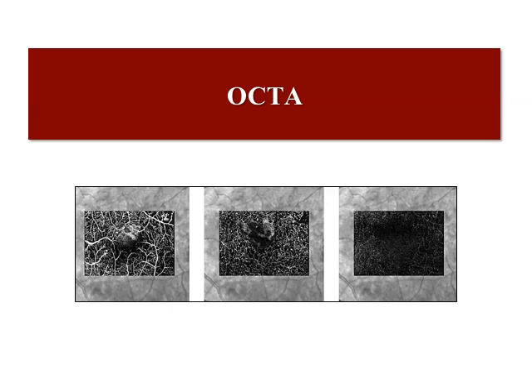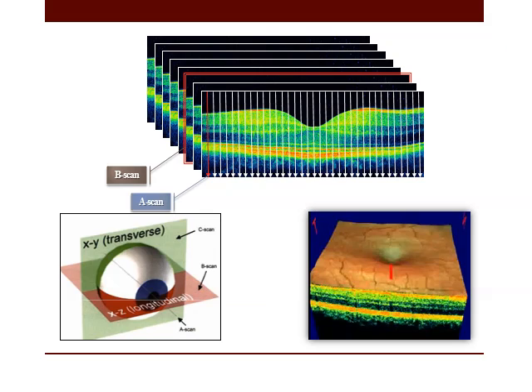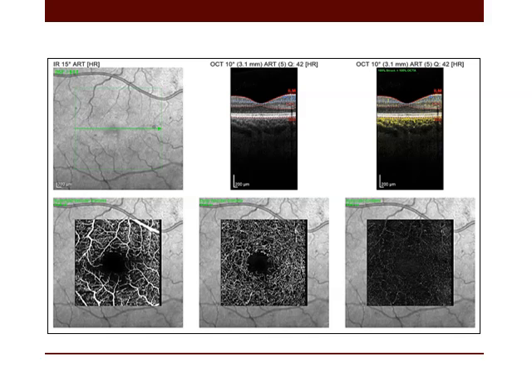The recent advance in OCT is OCT angiography, which is very helpful in diabetic retinopathy. It detects motion and projects it as a virtual image corresponding to the blood vessels. So the first image gives you the blood vessels, but like a black image. However, with motion detection in these blood vessels, they are projected white. This is OCT angiography. What are the disadvantages of OCT angiography?